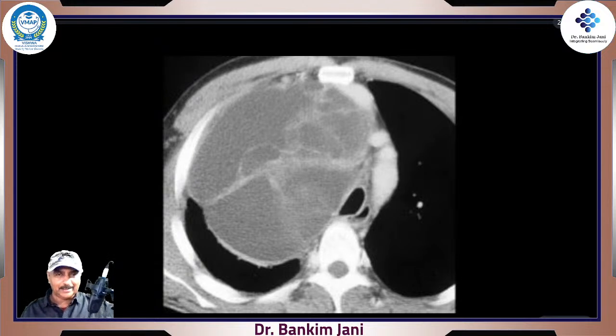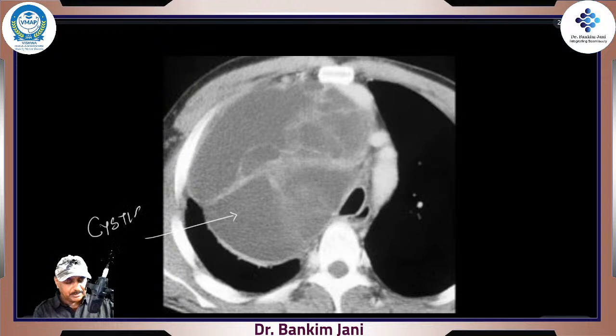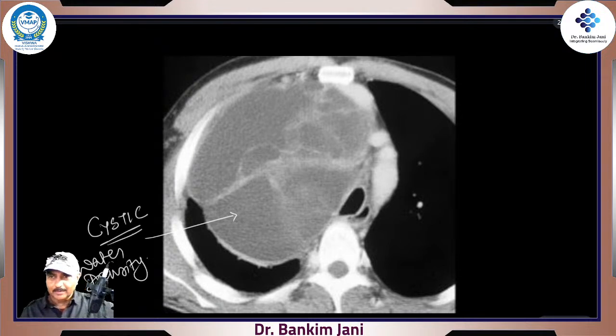This is once again another CT scan, and we are looking at this big mass. It is a pretty big mass. And all this is cystic, water density. Wait. Why lymphoma? That's why I tricked you a bit.